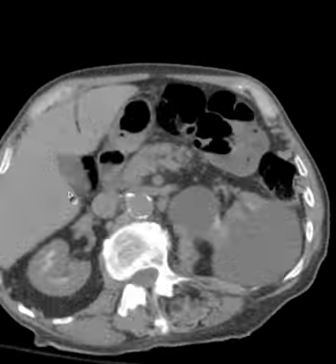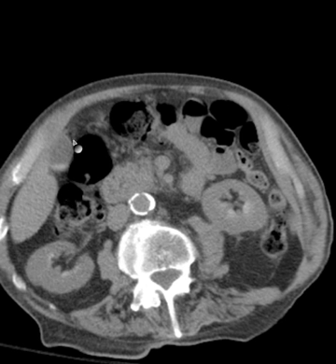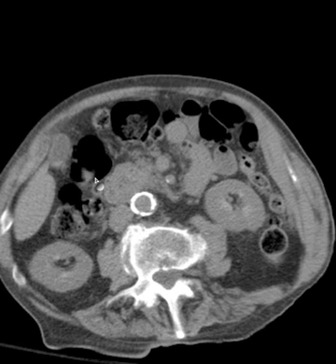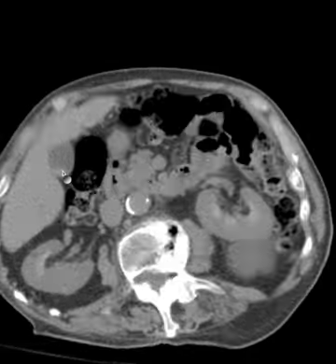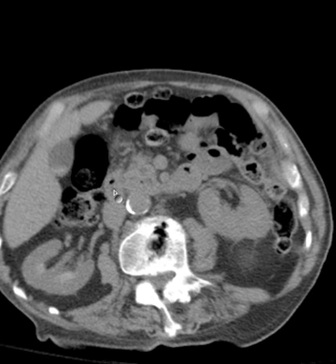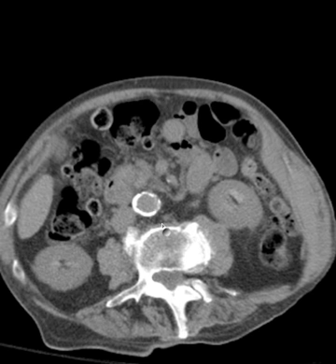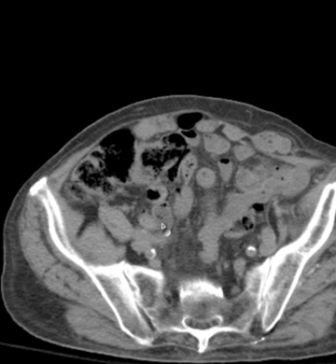So it's what sometimes they will describe, I will describe too, as vicarious excretion of contrast into the gallbladder. It's not really vicarious in the sense of what that word ordinarily means. But the point is that this could be from recent IV contrast administration, or it could be related to stones or sludge. Okay, so now we'll go down here a little bit farther, see if anything interesting develops.